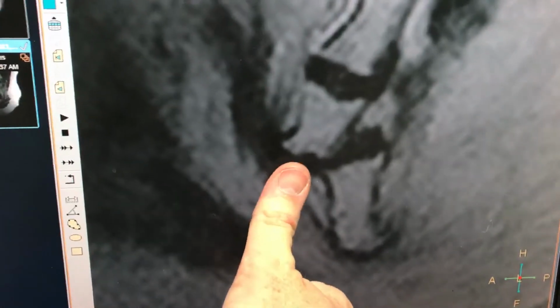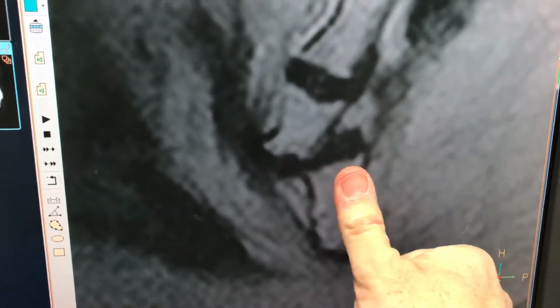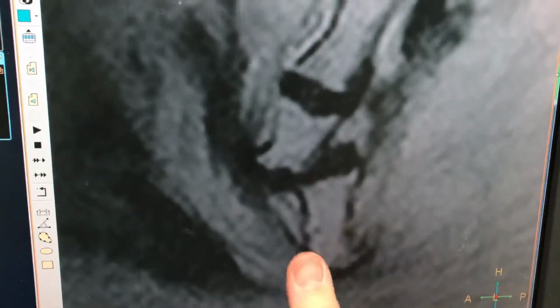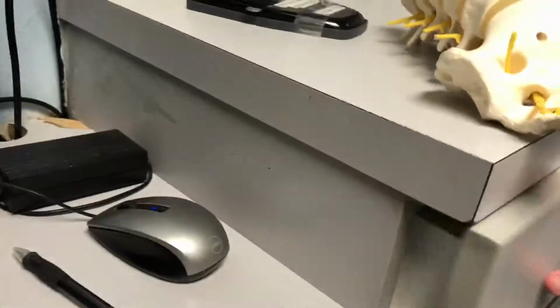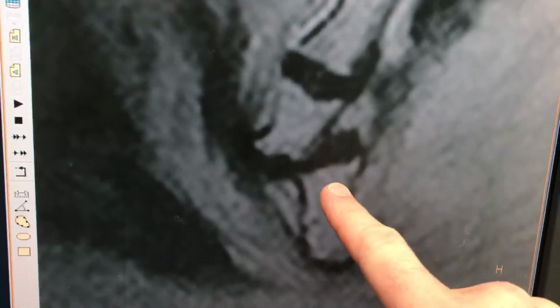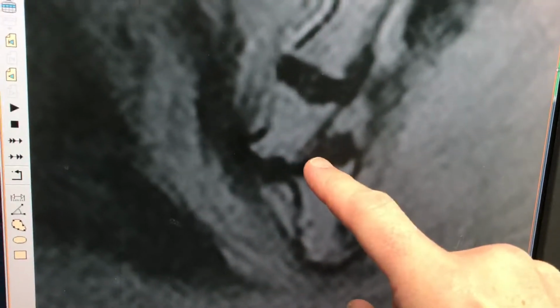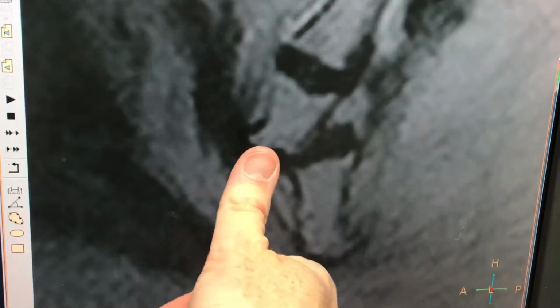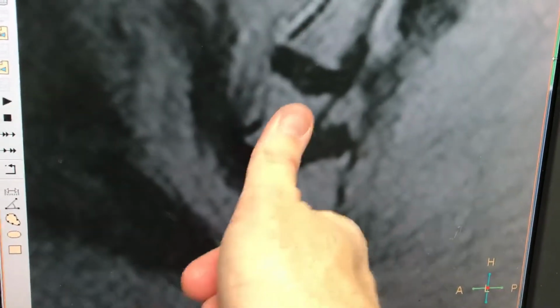So that next bone of the coccyx should be down here where my thumb is, but instead it has shifted or slid backwards. The medical term for this is listhesis, which just means sliding. So just like you could slide a drawer open or closed, you could slide a bone in or out from a joint space if that joint space is unstable. So this would be a joint where, just by the appearance here, we know that there must have been disruption or tearing, instability of the ligaments that normally would have held that bone into its normal position right underneath the bone above it.